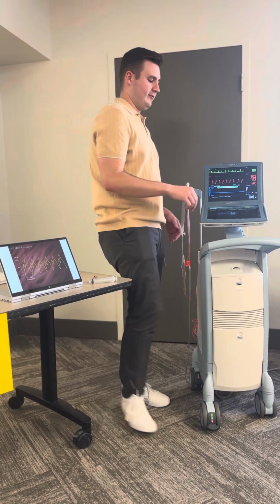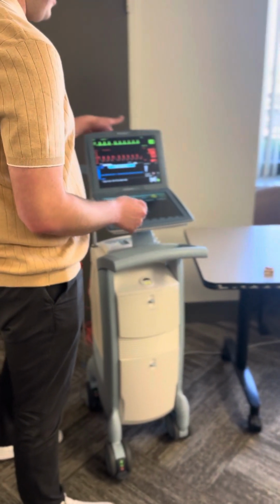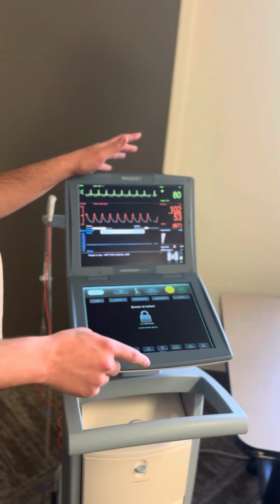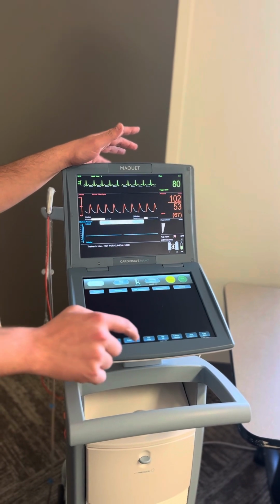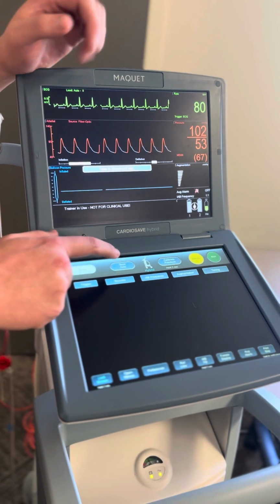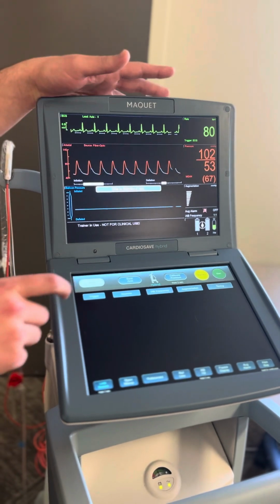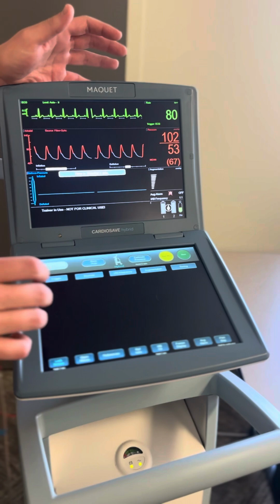So we can kind of move over here now, and I'll show you the rhythms. So the screen's always going to be locked when you're not using it. It's in standby right now. So all you have to do is hit unlock to unlock it. So we'll start here. It's always going to be in automatic mode. If it's in semi-auto, you can adjust other things, but for our purposes, it's always going to be automatic, unless there's a physician making changes or really specific details are happening.